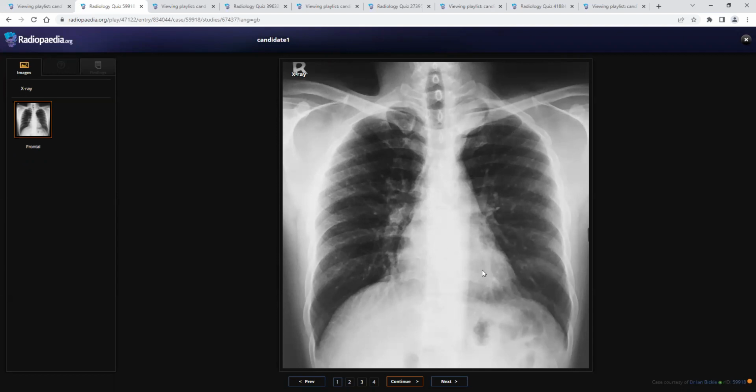This is a classical case of a benign thing. And what do you think the age of the patient is? Skeletally mature, around 20s, 30s. Yes, this is a very young patient. So in a young patient with a well-defined opacity, Pancoast tumor is very unlikely, and there is no bony erosion. You said no bony erosion, and you also said Pancoast, which go against each other. So you should be careful in your words. This is very much benign.